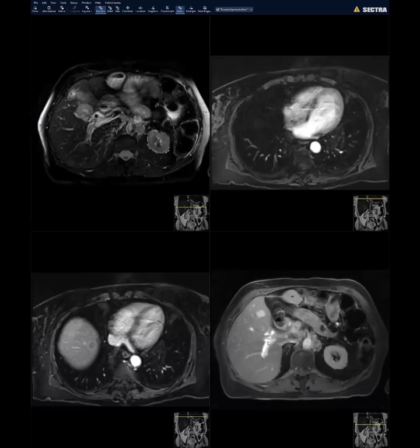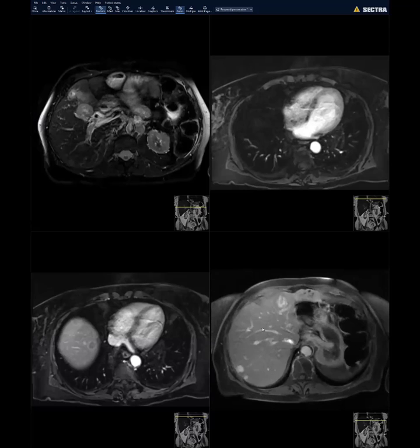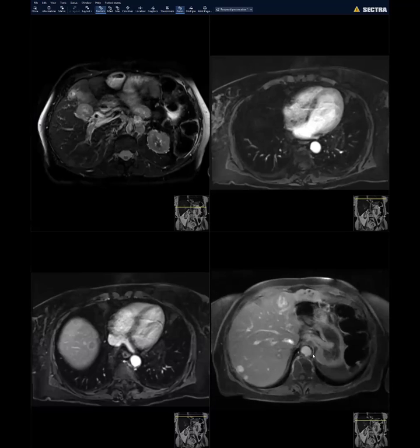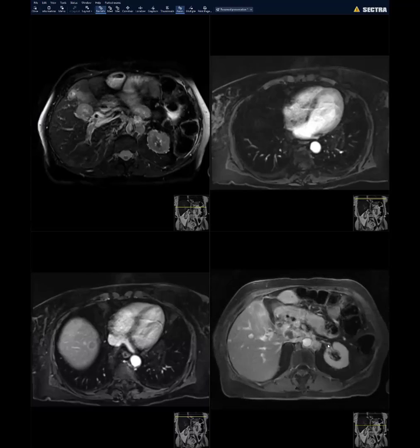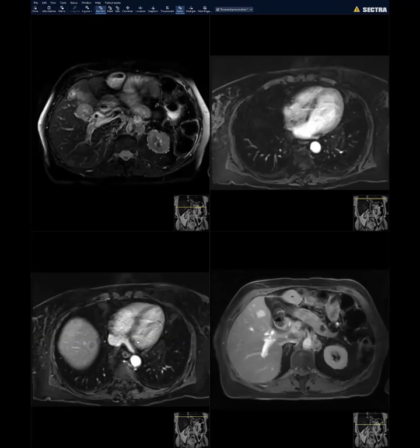There are differences, but if you didn't pay attention to the closer, smaller details, where is the arterial phase enhancement, where is the delayed fill-in, then you can get fooled. But this was an elderly patient. This patient had a known history of neuroendocrine tumor. They've had distal pancreatectomy. That's where the primary neuroendocrine tumor was, and these were all neuroendocrine mets.